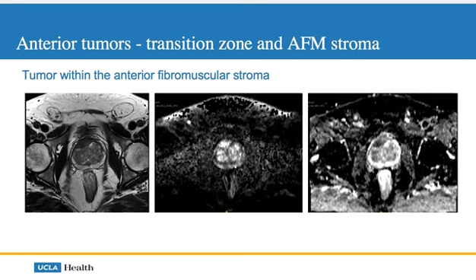So here's a patient. On the left, you see the axial T2 image, and you can see his peripheral zone here. It's relatively homogeneous. It's hyperintense. There's not a lot of hypointensity. You see maybe this little strip of hypointensity there, but that is more consistent with some kind of inflammation or prostatitis. This patient has relatively significant BPH, so you can see all the BPH in here, and it's hypointense, and it's very difficult to see whether or not that's actually prostate cancer or what that might be.